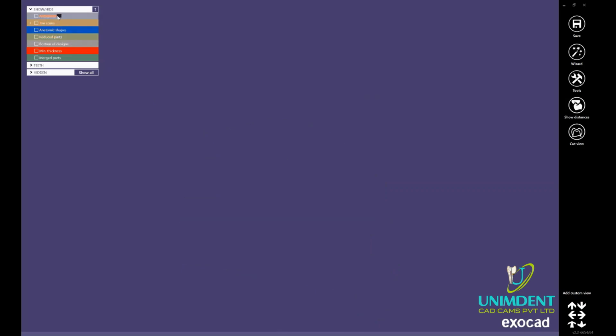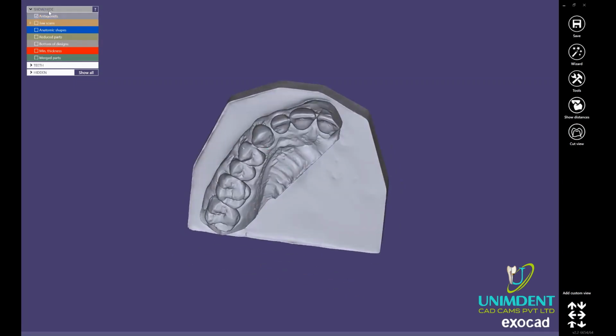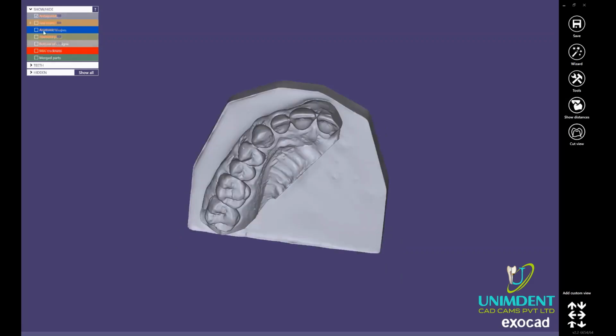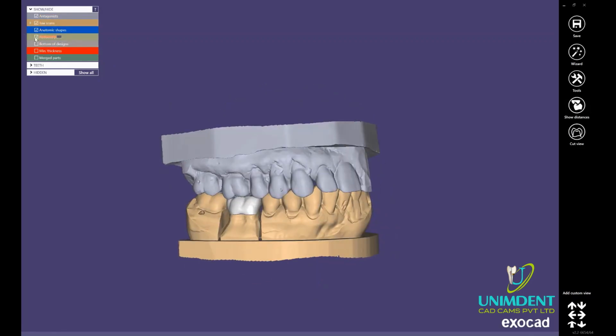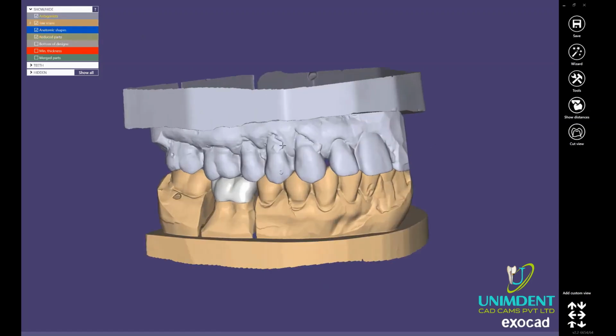By scrolling from right to left and from left to right, as you can see, I can make the mesh more transparent, right? And I can do this with any single mesh, okay? Jaw, anatomic crown, reduce, okay? So basically CAD is dividing our project in layers, okay?